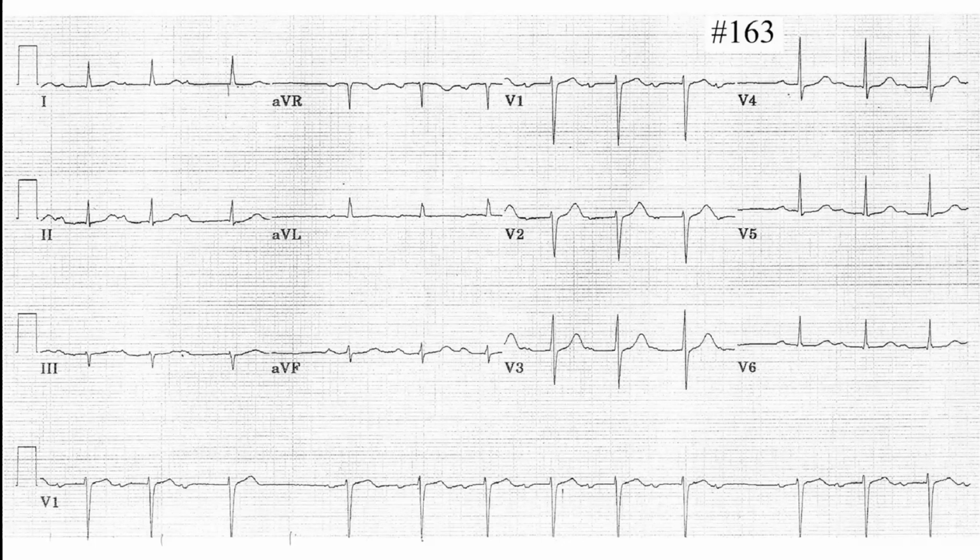All right. And for the axis, in lead 1 the P is positive, and in AVF it's biphasic. So I think it's normal. Yes, normal biphasic. So the axis is normal, 0 degrees. That's normal. Okay. Go on. And now the P waves. For P waves, 1, 2.